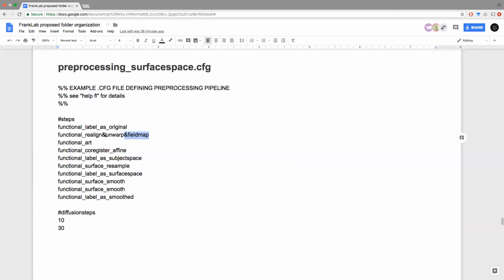When you are moving within a mirror that is curved, then the shape of your reflection looks different. So the same thing happens within a non-homogeneous field map: when you move within the scanner, if the subject is moving, then the apparent shape of the brain is going to look different, correlated with how the subject is moving. So the unwarp tries to correct for the relative changes in the shape of the brain that correlate with the motion of the subject.